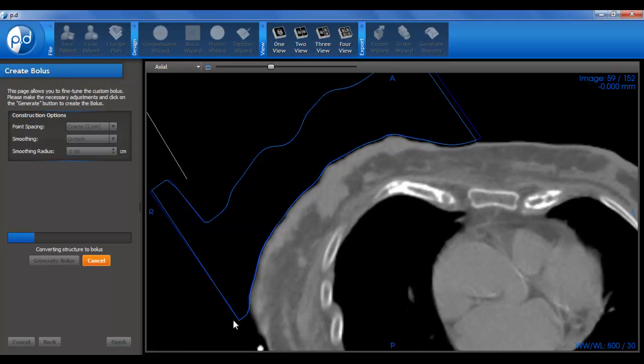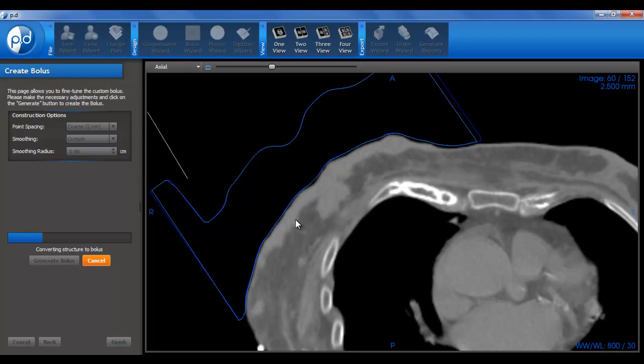So right now, we see a very good agreement between the 2 boluses. In fact, on this bottom distal surface, we really can't tell a difference between the 2 surfaces along most of the slices. We're going to see with the rolling ball, however, when we come from the outside, that means the rolling ball is going to be applied outside of the bolus. So it's going to be above and below the bolus. And what we're going to see is we will never protrude into the bolus part. Instead, we're going to protrude outside. That's why the rolling ball is called outside.